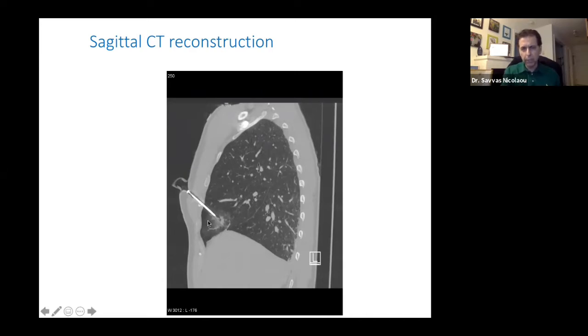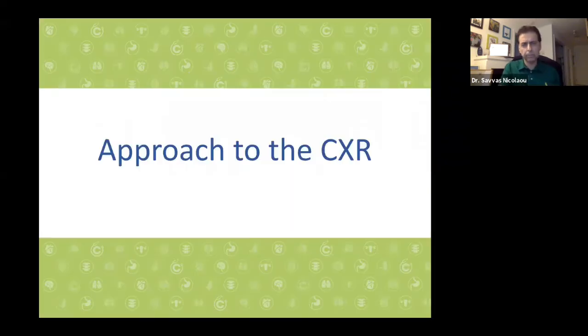We can see this is the major fissure. This bright stuff that you're seeing is pulmonary hemorrhage, blood within the lung itself. So we know the location, we know the length, we know the trajectory, we know what vital organs have been damaged. So this is very important information for surgeons. They can only be obtained from a CT given the sub-millimeter delineation of anatomical structures. Compared to the chest X-ray, very useful, but it's only a 2D representation of a 3-dimensional structure.